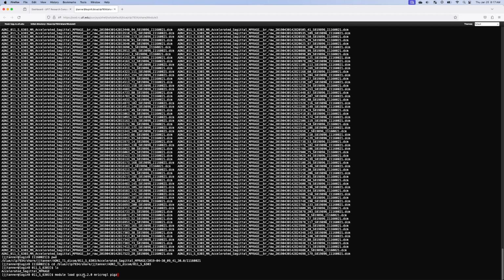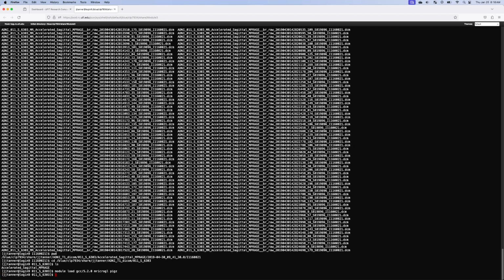And so that's why we're loading that one. But pigz is a fast way to compress files. So we're going to save these files out as a NIfTI file, but one that is compressed, as it's gzipped. And so we load these. Notice there's always spaces between the names on here. These are different ones. And so now they're available.